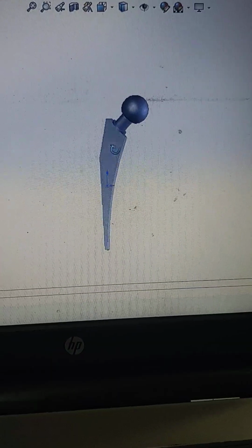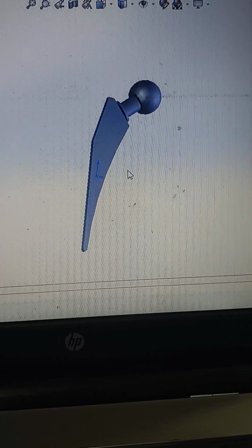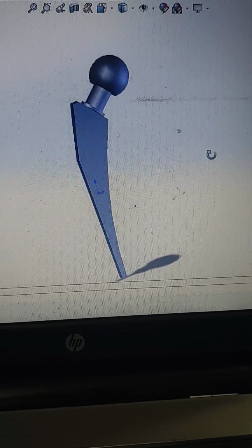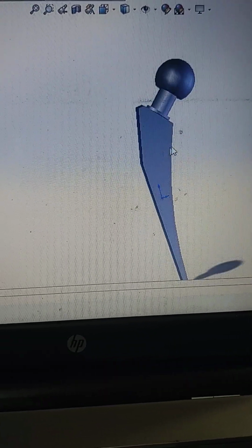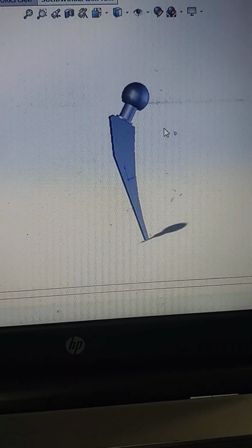So this implant must be designed in a geometrical way and a material way to withstand the highest load during certain physical activity like stair climbing. So biomaterial is one of the crucial elements of designing an orthopedic implant in computational biomechanics, medical engineering, or bioengineering.